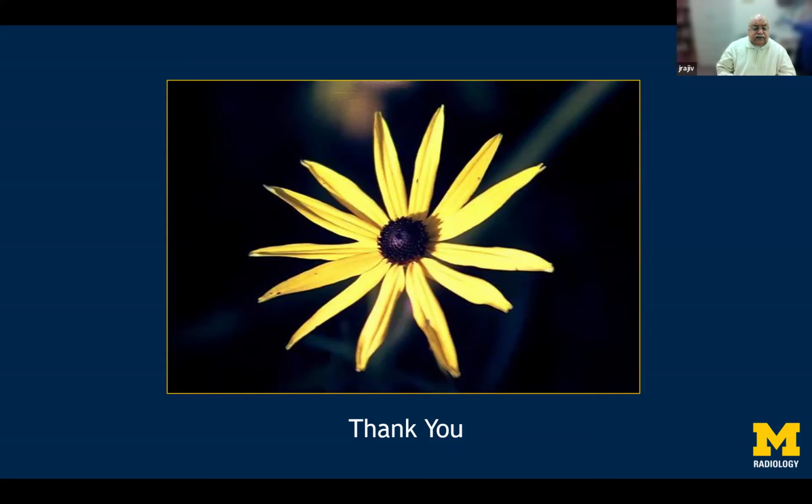So it's a template that is built to be a little bit more intuitive. It is not AI developed. It is humanly developed. So we just make sure that we see everything. So normally the idea is how to see a CT scan for the maxillofacial region. I usually begin with the coronal scan because that's very easy to do, and then correlate each with them.